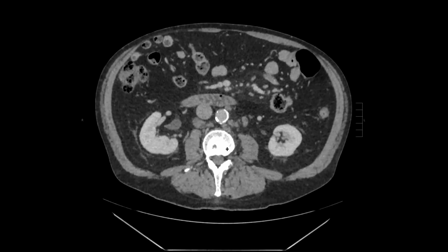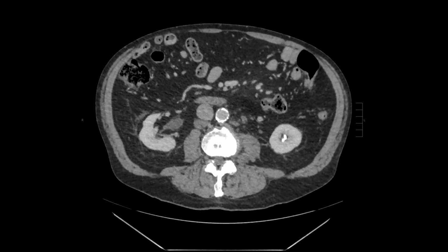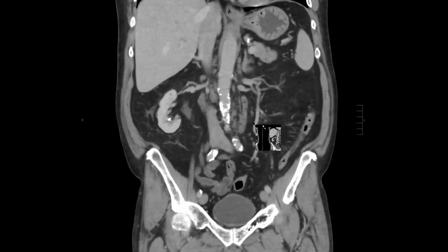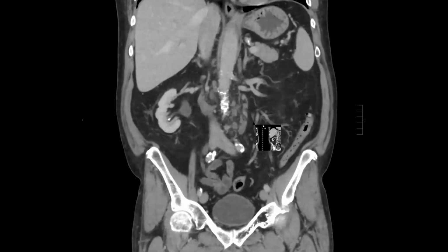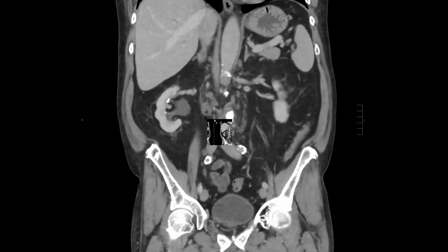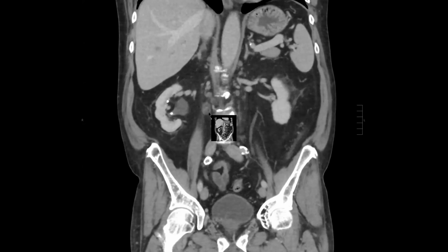to therapy, apparently. Is it the fatty hilum coming back, and were those nodes smaller now, or are you saying it's a fatty dot in it? It doesn't make it look like it's back to having a hilum. I don't know if it's the hilum that's hypertrophied or additional fatty dots in addition to the hilum, but you get these. From my understanding, it's just these blobs of fat within the treated lymph nodes after this kind of therapy.